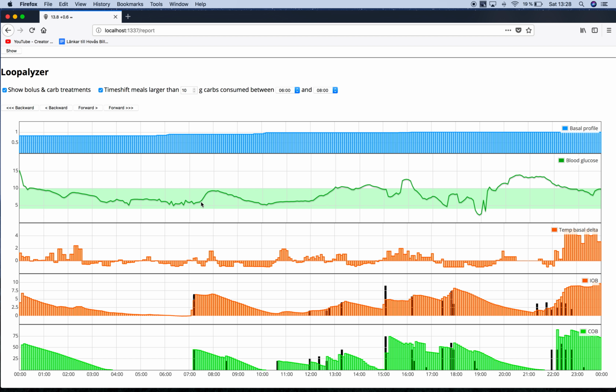So this actually gives you a much better view. You can average over a number of days, and you can still have them time aligned on certain spots. And of course, if you time align on breakfast, you should really not pay much attention to the data that are happening later in the evening, for example. So time align or time shift is more relevant from the starting point than just a few hours, maybe for the full duration of the insulin action.